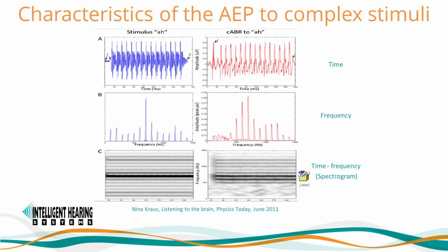FFR response waveforms have been converted to sound waves. When these files are played back, they sound very similar to the original stimulus that evoked them.